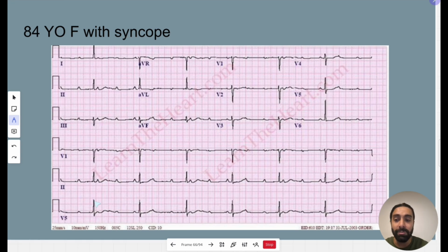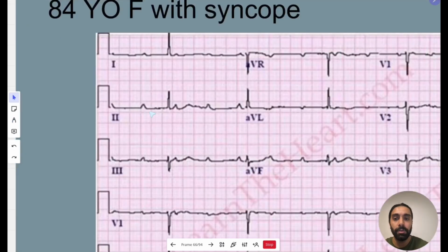So you have a very significant bradycardia, as noted on here. And so when you think of bradycardia, your differential should be blocks. You see a positive P in lead 1, this huge PR interval. And then what is this thing right here? And then you see maybe another T wave, or who knows what that is, and P wave, P wave. So we're getting into the blocks realm because you're seeing these lone P waves.